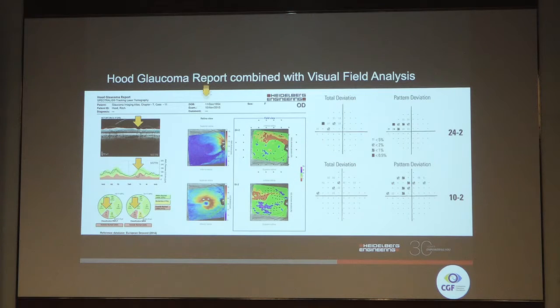If everything is correlating, then you look at these deviation maps. You can see the RNFL change, there is no RNFL there, so the blue is the defective area. Similarly, when you see the GCL map, again you have an area where there is a defective GCL. We all understand the fields are always the flip. If you look at this area, you can see the change is happening over there. That is the 24-2 visual field, compared to the Humphrey. And here, this is the GCL map, which is the central zone, central 10 degrees. So it is 10-2. We can easily correlate in the visual fields here.